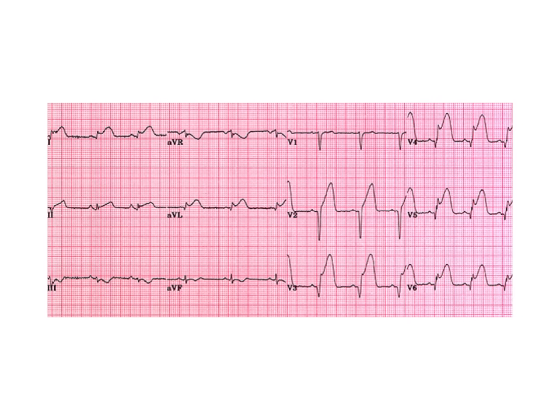What do we see here? Pause the video if you need more time, and in 3 seconds, I'm going to tell you. This is another STEMI, but this one is anteroseptal, right? So look at the red arrows. Those are ST segment elevations that correspond to V2, V3, V4, V5, and V6. V5 and V6 are lateral, and V2, V3, and V4 are anteroseptal. So we combine them, and we say this is an anteroseptal lateral STEMI.